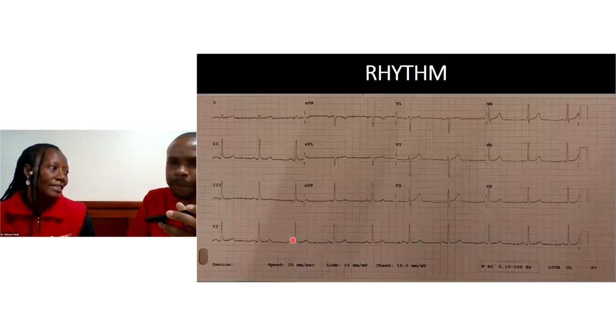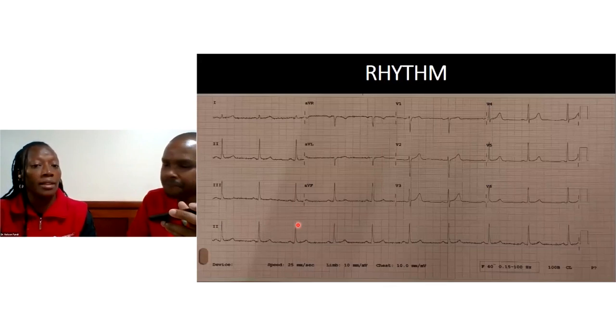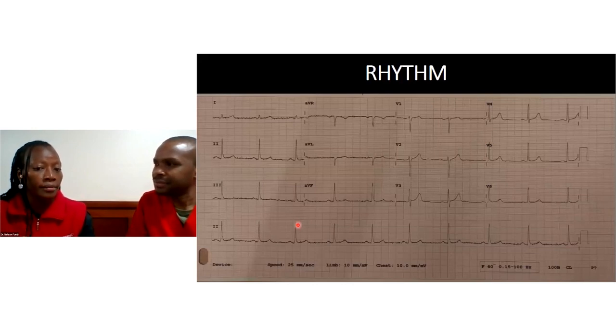There's no science here, just tracing between beats. You could possibly take an RR interval of 2 beats. Then with that, you trace against the two other RR intervals that are after that. And if the markings are falling in place, then you say your ECG is regular. If they do not fall in place, there are disparities, then you say that your ECG rhythm is irregular.